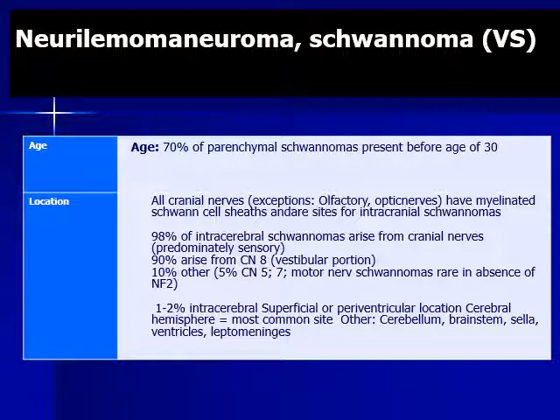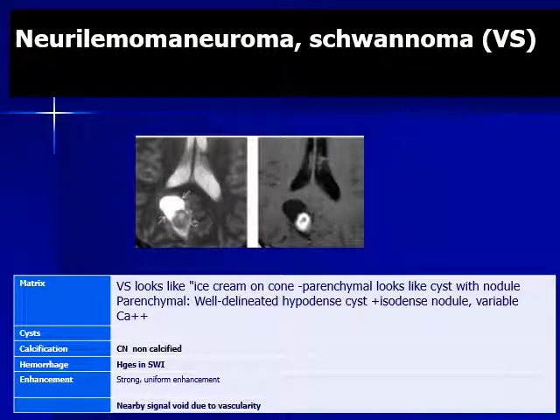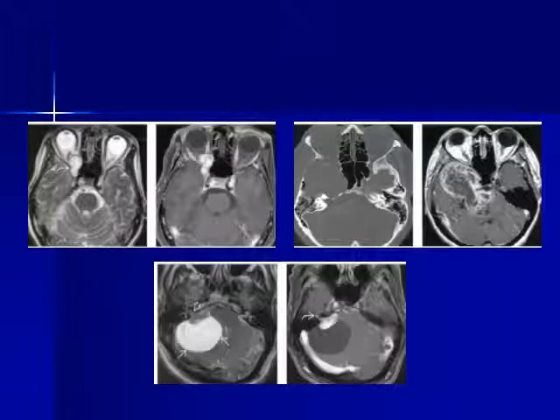Sometimes the schwannoma originates inside the brain itself, intracerebral, and this is rare. And when it is presenting there, it presents as a cyst and nodule, as if it simulates ganglioglioma or PXA or pilocytic astrocytoma. Don't be astonished if the biopsy returns that it is a schwannoma. But the classic teaching is that it affects the cranial nerves. And these are examples.